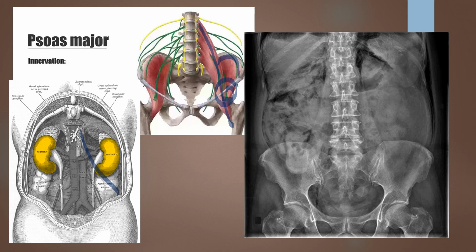The other interesting thing you're seeing here is that you look at this and think, oh my gosh, what beautiful technique, I see so well. Well, the problem is you're seeing so well because this patient has a pathologic problem. Take a minute and think about what that might be. You might see that you have a lot of air here, here, here. Here are the psoas muscles, and we can identify them really well. Over here, I can see the liver really well. I shouldn't see the liver that well. Over here, I can see the spleen really well, and I don't usually see the spleen that well.